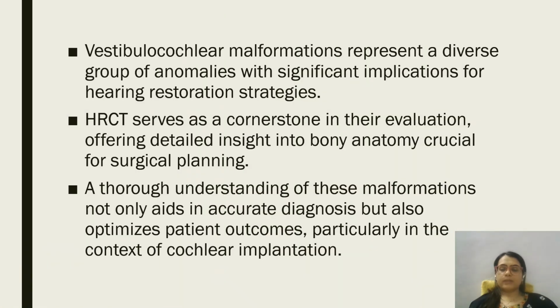Vestibulocochlear malformations represent a diverse group of anomalies with significant implications for hearing restoration strategies. HRCT serves as a cornerstone in their evaluation, offering detailed insight into bony anatomy crucial for surgical planning. A thorough understanding of these malformations not only aids in accurate diagnosis, but also optimizes patient outcomes, particularly in the context of cochlear implantation.